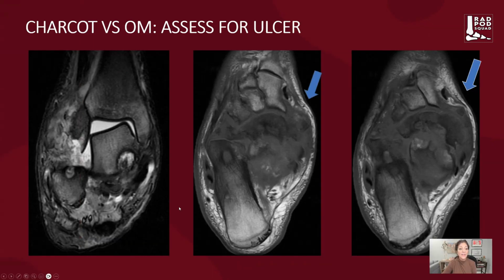And the MRI for that patient, we can see the tibiotalar subluxation that's occurring here in this varus angulated patient, and even more that the calcaneus is lateral to the talus. So this is a talocalcaneal complete dislocation. And what we're really trying to assess on this patient, if there's the presence of an ulcer, is where the T1 infiltration is. Luckily, in this case, there was no ulcer.